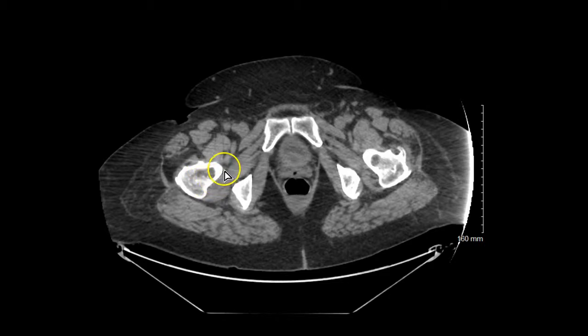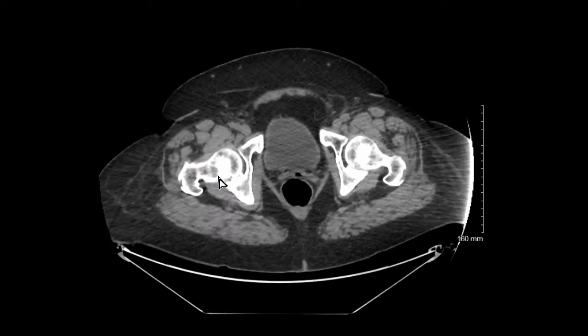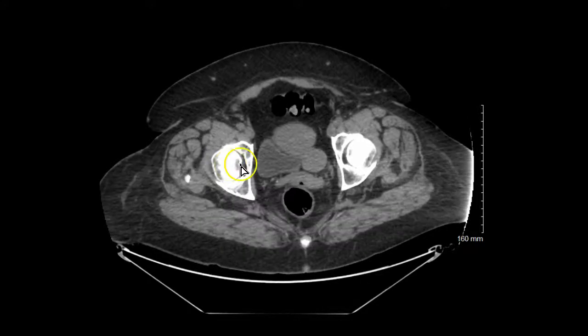And when we're visualizing the femur, you can see, all right, midline, we know that that's the lesser trochanter. So you can visualize the vast amount of structures going into the femoral head and greater trochanters here, external to that, or lateral to that. So a lot of structures here.